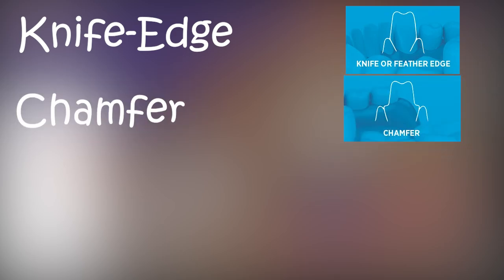The chamfer finish line is one of the most commonly used designs. It provides a rounded, concave margin that allows sufficient material thickness while maintaining smooth transitions. Chamfers work very well with zirconia restorations and are easy to detect and manage in Exocad.